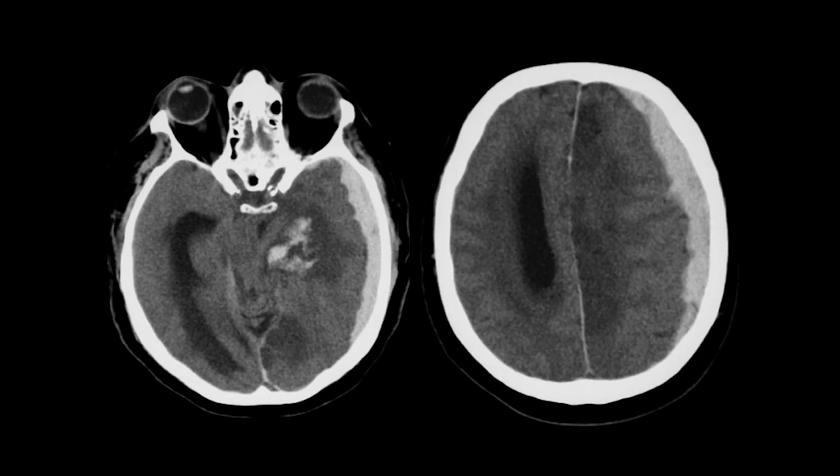Again, to summarize, the approach that I take is to start at the outside, looking for scalp injuries, the site of contact between the brain and whatever object it hits, and then go layer by layer until you reach the center of the brain.